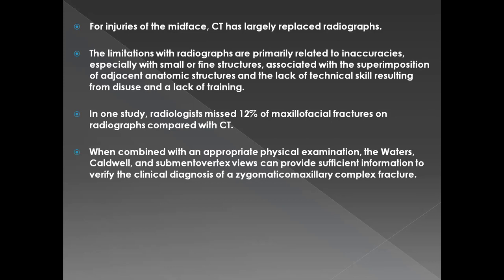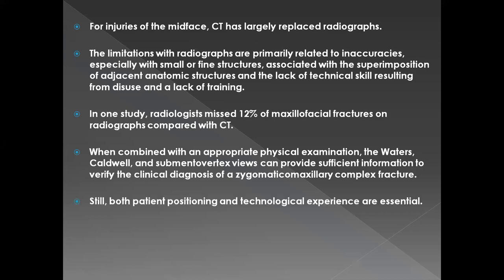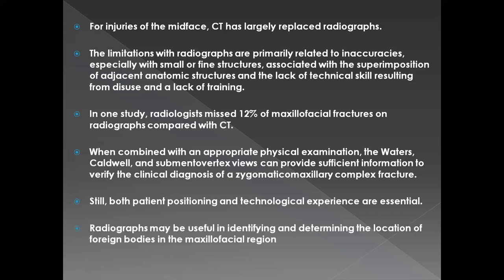However, when you combine your physical examination with the Waters view, a Caldwell view if indicated, and a submental vertex view, you can get sufficient information to verify the clinical diagnosis of a zygomatic-maxillary complex fracture. So like I said, with plain X-rays, you can diagnose a fracture, but you can't really treat and plan a fracture. That is the major reason why we opt for CT. Still, both patient positioning and technological experience are essential. Radiographs may be useful in identifying and determining the location of foreign bodies in the maxillofacial region.